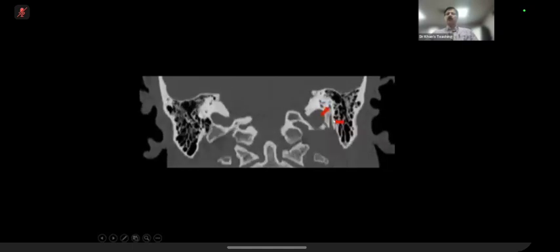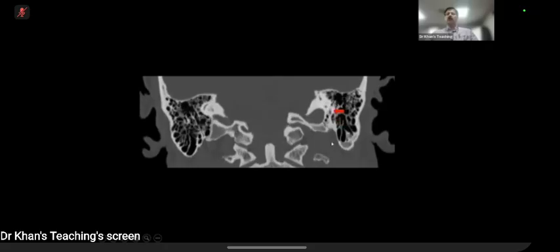Now this is the tympanic portion, and we are going posteriorly, and we are expecting it to dip down vertically, and on a coronal you will see it very well. You see this thing, it goes vertically down like this, and you can imagine that this is the stylomastoid foramen, and here will be the parotid gland. Now if you see the relationships, here is the epitympanum, this is the scutum, this is the external auditory canal.